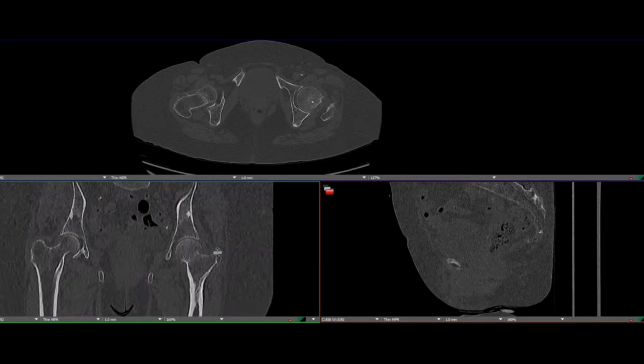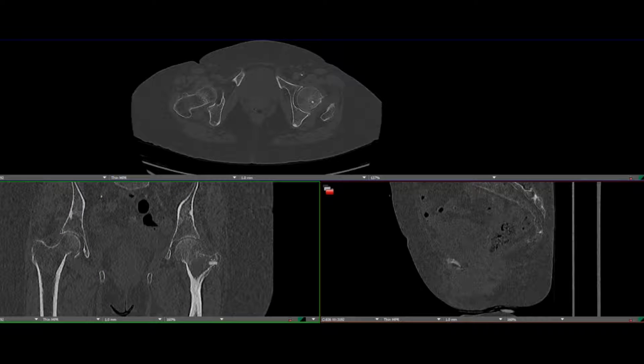The location of femoral neck fractures can be described as subcapital, transcervical, or basicervical. The subcapital and transcervical fractures are at higher risk for osteonecrosis of the femoral head. The valgus impacted subcapital femoral neck fractures are at particularly high risk of femoral head osteonecrosis, as the lateral epiphyseal artery inserts right at this location. The lateral epiphyseal artery is what provides much of the arterial supply to the femoral head.